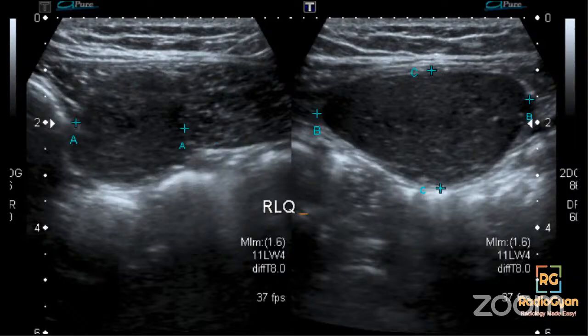So excellent differentials by everyone: desmoid tumor, epidermal inclusion cyst, endometriosis. Ayush says that this could be a pseudotestis appearance, which is typical of an epidermoid cyst. The only thing that goes against an epidermoid cyst is the location of the lesion. I know it may be difficult to identify in limited still ultrasound images, but this is slightly deeper.